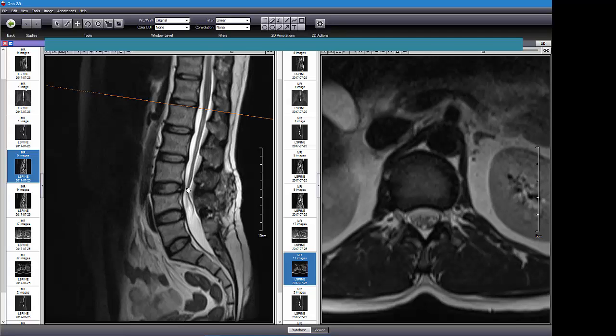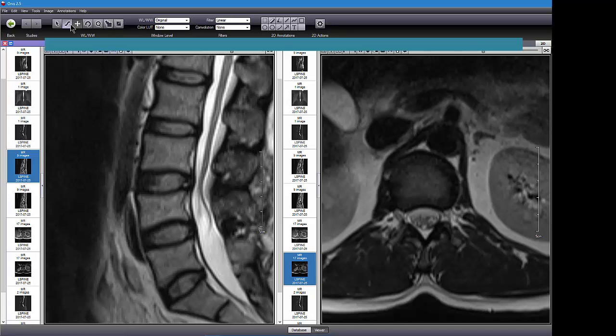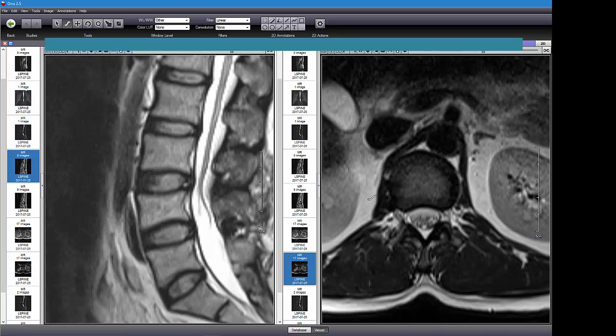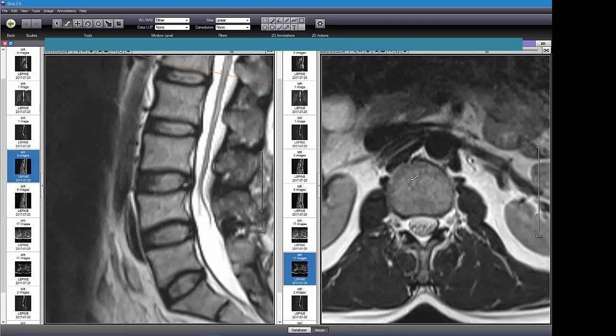Now you can see the cauda equina coming down here. You can see it just gets disrupted here where that area of moderate to severe stenosis is. And as I said in the last part, you can see an HIZ sign, which is often indicative of an annular tear. It doesn't always mean it's painful, though. There are people who have annular tears and they're not painful. We don't know why some of them can be so painful and some of them aren't. But there's some research that shows if you go on to do discography, about 85% of the people who have these will have concordant pain. And that turns out to be the meeting point of a concentric tear with a full thickness radial tear. That's what it turns out to be in some papers anyway.